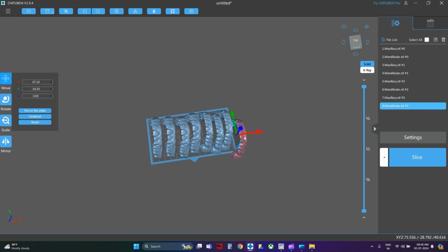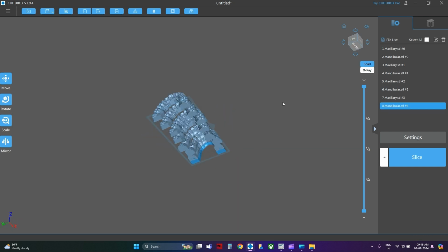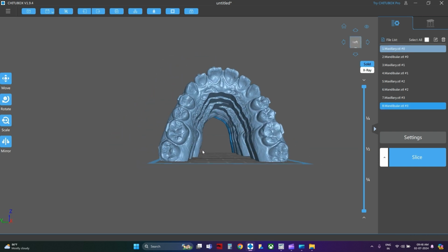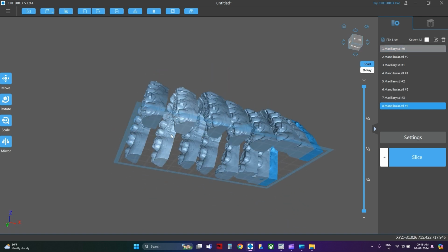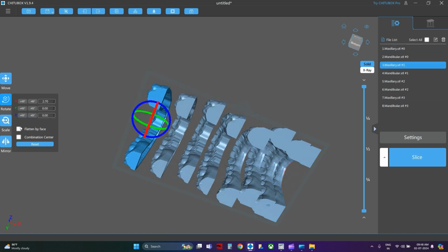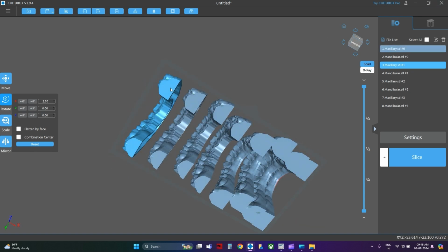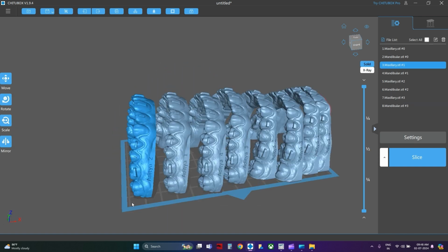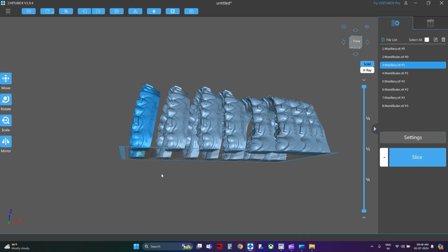All right, so let's go and evaluate. Let's see if we can get them to touch the build plate well. Let's see whether we can try and get it flattened on the plate somehow, but that's not happening, so that's okay. We will start the moment you start seeing pink.